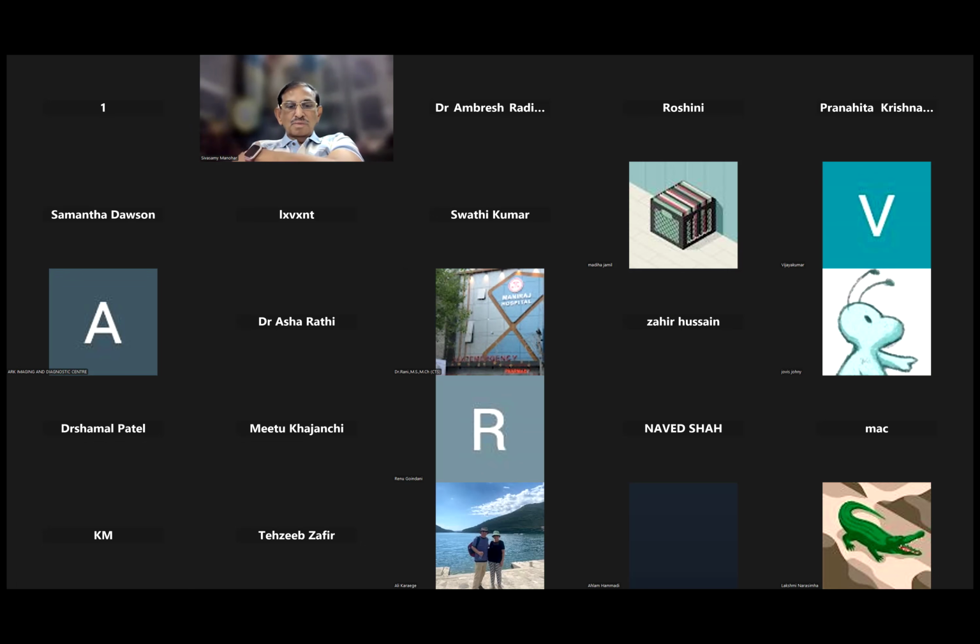Pragnita, please, you can continue the proceedings. Yes. Actually, anything in ultrasound is only pattern recognition. So first we should really learn how to know the abnormal from normal. So Roshni, can you just tell us how to systematically examine the limbs? Because that's the first thing we have to do.